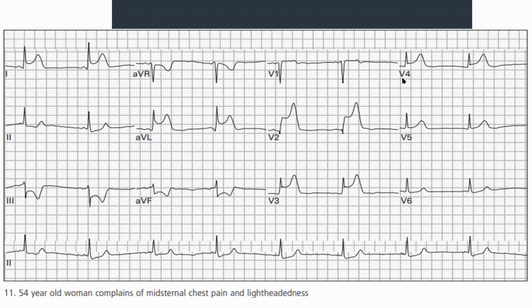So this one here is actually close to something that they call a tombstone MI. Tombstone MIs are when basically the ST segment and the T wave combine. There's two reasons why they call it tombstone. It does actually look like a tombstone and it tells you about the prognosis. So this is very close. No, I didn't come up with that. So it's quite a serious thing.